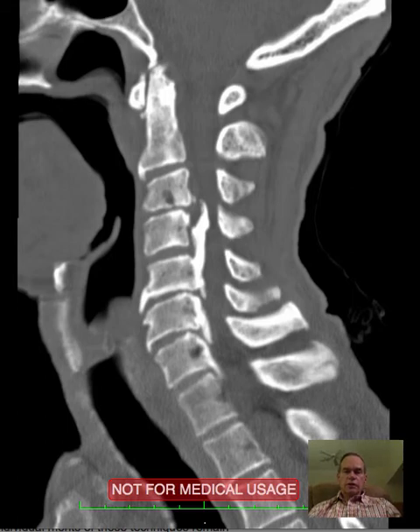This is a relatively uncommon disorder known as OPLL, that's ossification of the posterior longitudinal ligament. It's associated with calcium pyrophosphate deposition disease and ankylosing spondylitis, and is characterized by thick areas of ligamentous calcification, even ossification, which extend two or three or more levels.